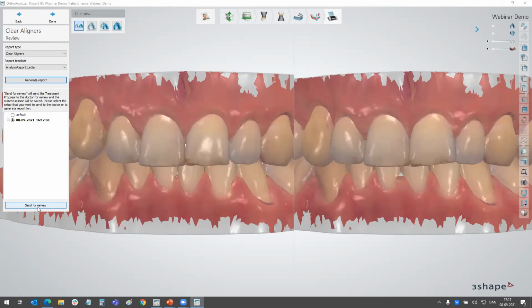In the US, the FDA would like to ensure that the users get a warning if they try to make the walls too thin. But in the rest of the world, you will be able to choose any printer. The software will have the exact same shape of the hollowing, and you can just choose any printer and then choose the wall thickness that you would otherwise use for your machine. But that's only for outside the US.